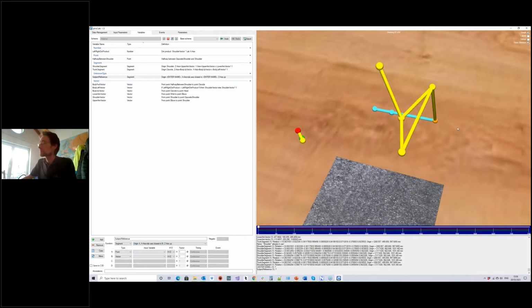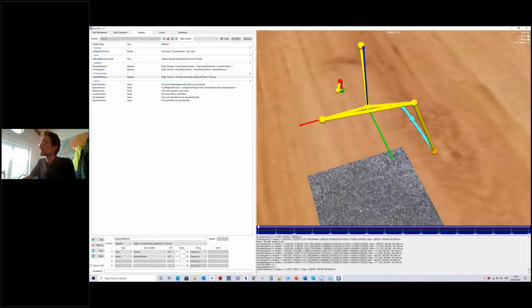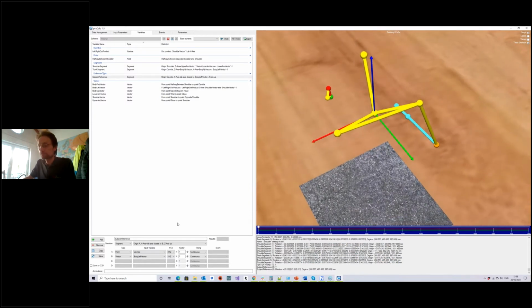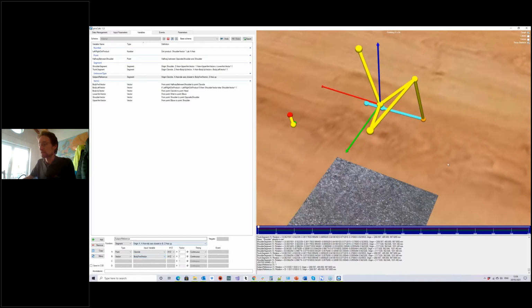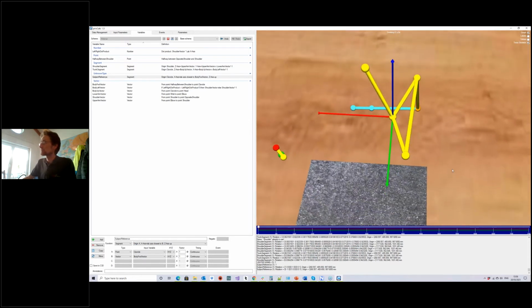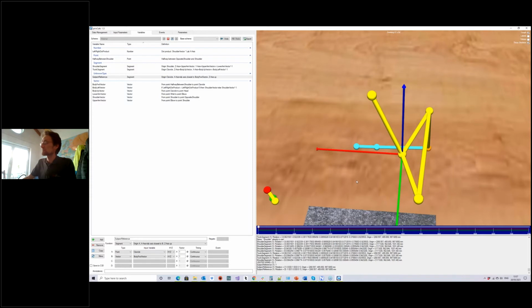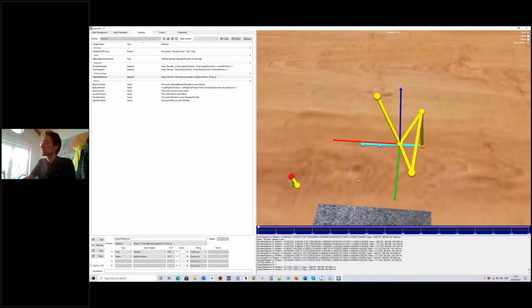So if I select my clavicle as the origin, it doesn't really matter exactly which one it is, and I select the body left vector, and the body forward vector, of course, as my x-axis, then what we see here is that ProCalc has aligned the forward axis with the lab axis that is closest to the forward axis.